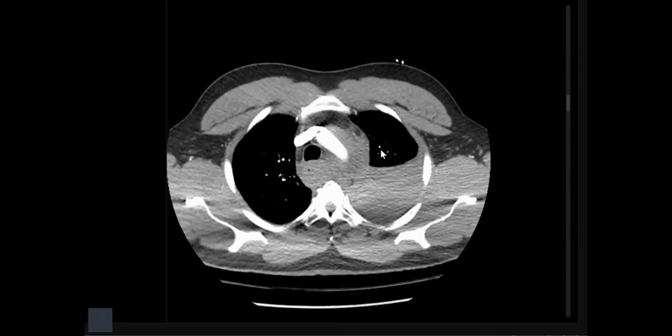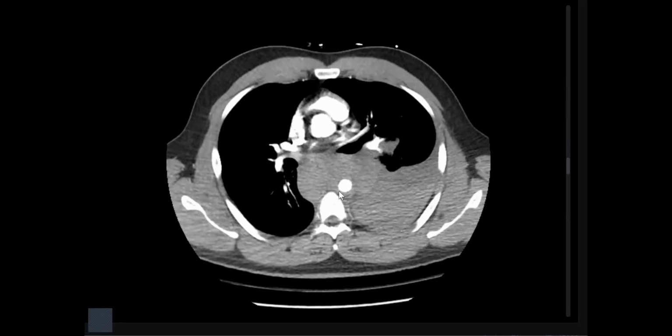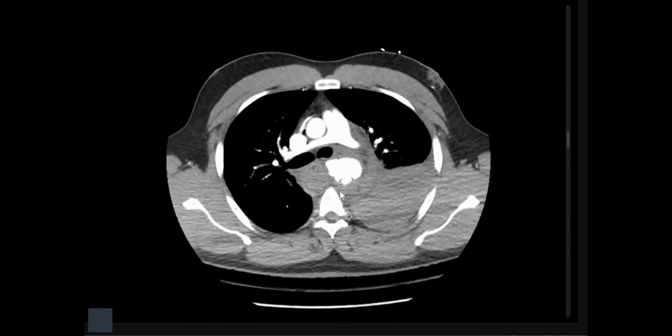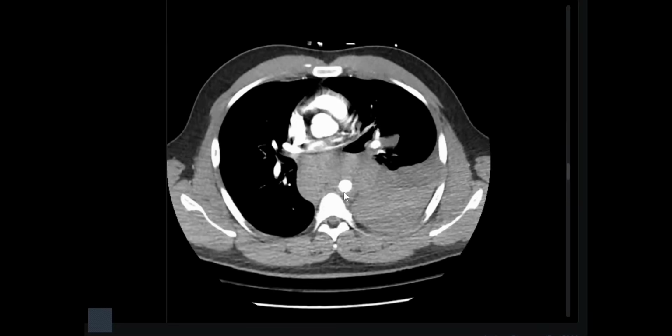You mentioned extravasation and aneurysmal dilatation. Which one are you sure about?